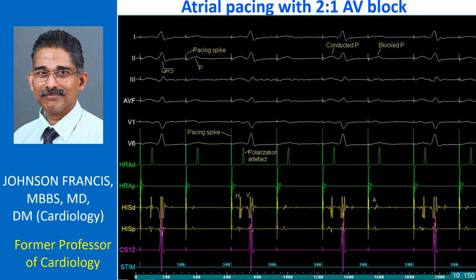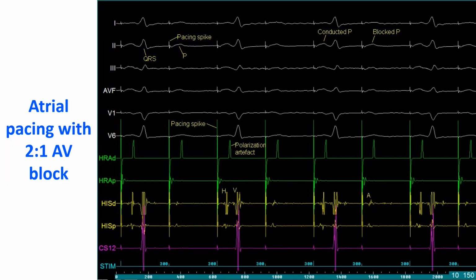The width of P waves and QRS complexes are more than the usual because the recording speed is much higher for an EP study, usually 100 or 200 millimeters per second, rather than the 25 millimeter per second for usual ECG tracings. Higher recording speeds are used to delineate short intracardiac signal intervals well.